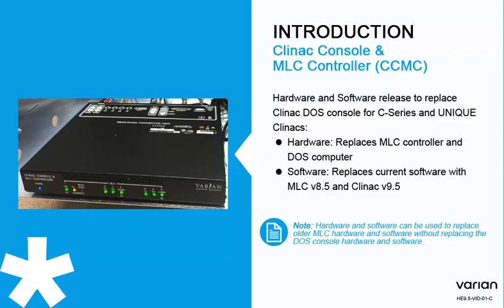Clinac Console and MLC Controller, CCMC. This is a hardware and software release to replace the Clinac DOS console for C-Series and unique Clinacs. On the hardware side, it replaces the MLC controller and DOS computer. On the software side, it replaces current software with MLC version 8.5 and Clinac version 9.5. Note, hardware and software can be used to replace older MLC hardware and software without replacing the DOS console.